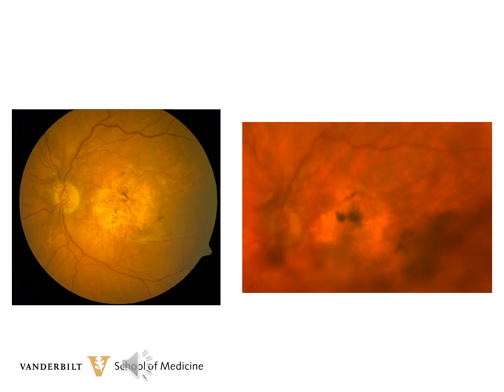And here are two more clinical photographs of that same patient. On the left, the photograph was taken 7 years after the photodynamic therapy. Her vision at that time was still stable at about 20/40. However, look at the macula and you can see there has been progressive atrophy of the pigment epithelium and the choriocapillaris. However, also during the 7 years, she required no medical treatment or injections of any kind.